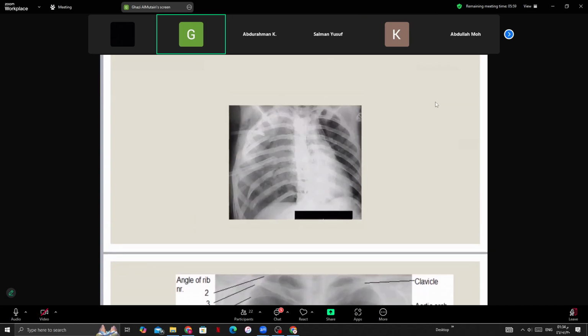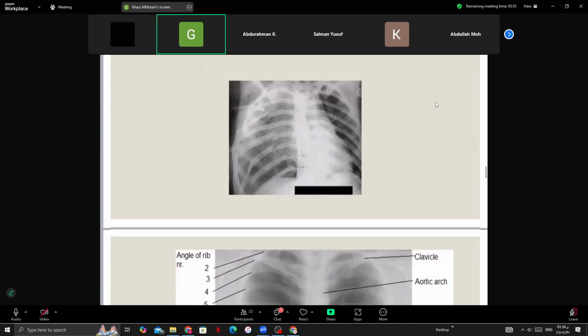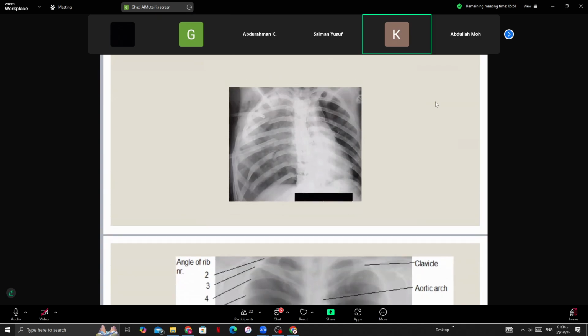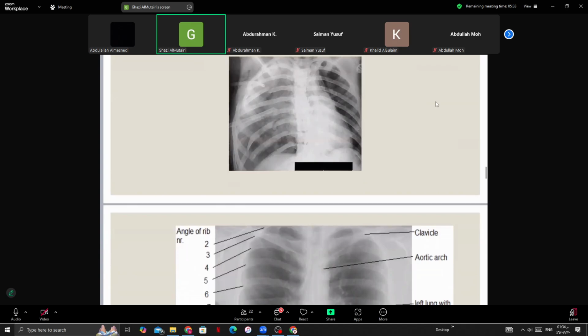بس by X-ray how do we identify or define a flail chest؟ It should be 2 consecutive ribs, it should have fractures on both sides. هنا عنده multiple rib fractures, so more than 2 ribs, with each rib having fractures on both sides, يعني يكون عندك 3 fragments.